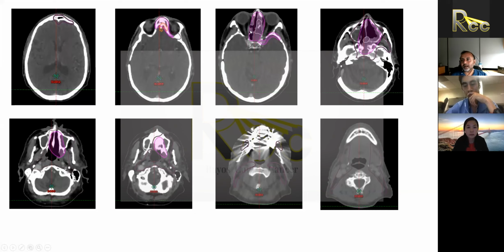I'm treating the entire sinus right there. I'm treating bilateral cavernous sinuses right here. And in this patient, because there was anterior cranial extension, middle cranial extension here, we're actually treating the sphenoid wing here in this patient because the patient actually had known dural disease pre-chemotherapy right in this location. So you can see that that dural margin here is now getting 60 gray and 54 gray.